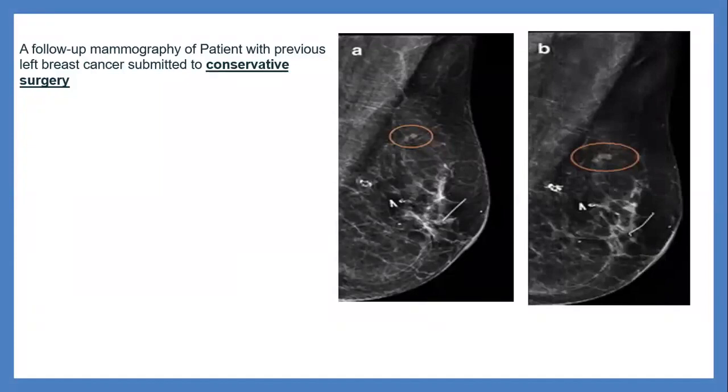Okay, this is the other view. This shows the largest one with abnormal focal thickening with center lucency. I think this represents an intramammary lymph node. And the smallest one, I couldn't appreciate this. I will say atypical. I will say there is a lesion.